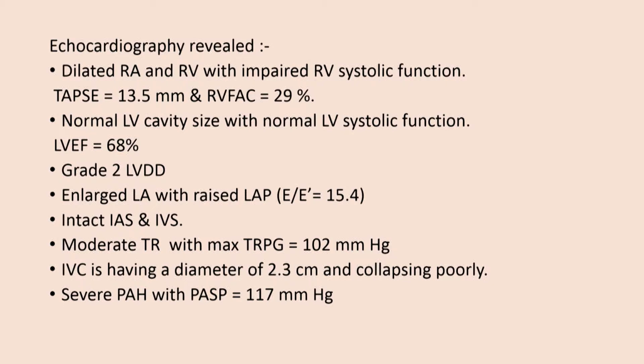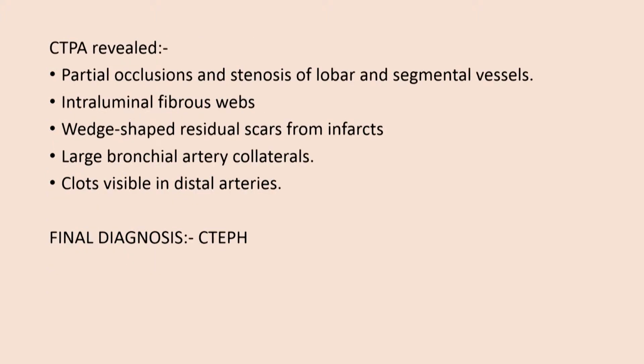Now, this exactly couldn't explain the fact that the patient has a lower lobe aspergillosis. It was not explained by that only. Considering that he was having a DVT, pulmonary CT angio was done, and these are the findings over there, which confirm the diagnosis of chronic pulmonary thromboembolism.